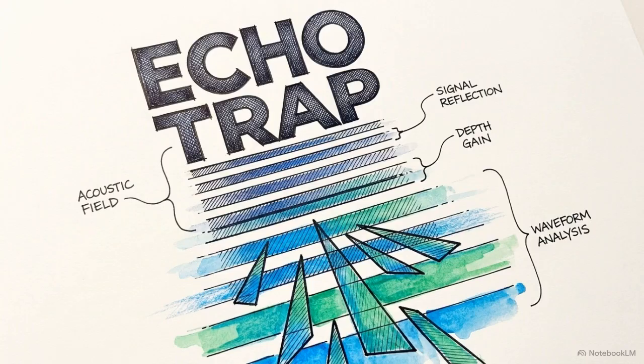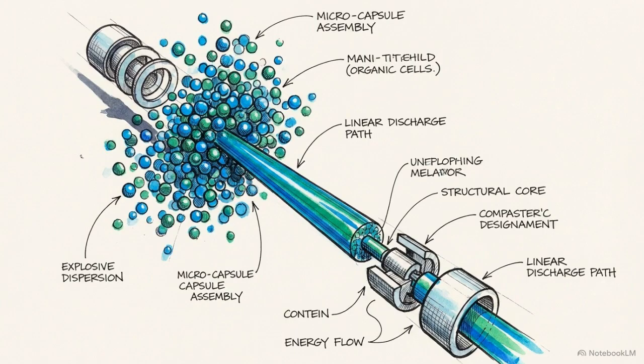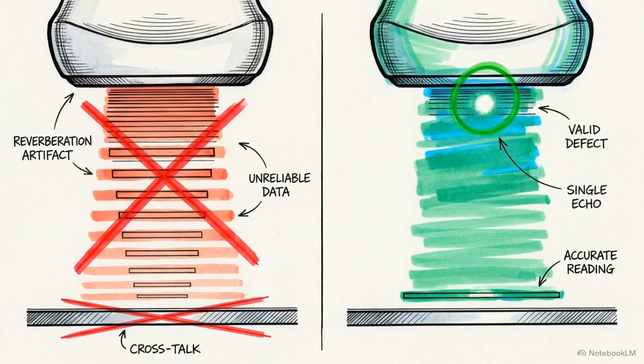This multipath error is categorized globally as a reverberation artifact. In clinical practice, this presents in two primary ways: a comet-tail originating from metal or dense calcium, and ring-down originating from microscopic gas bubbles. Seeing these uniform stripes, clinicians ignore the false deep structures. Instead, they look for trapped metal, calcium, or gas right at the surface.